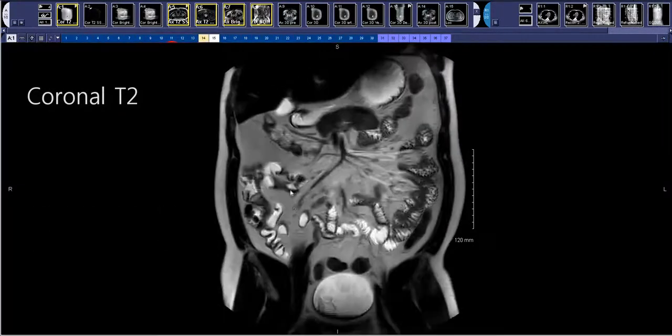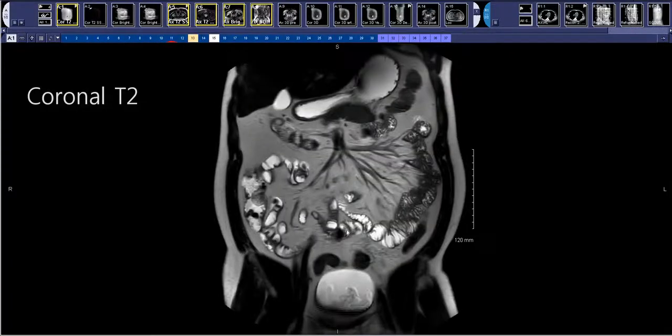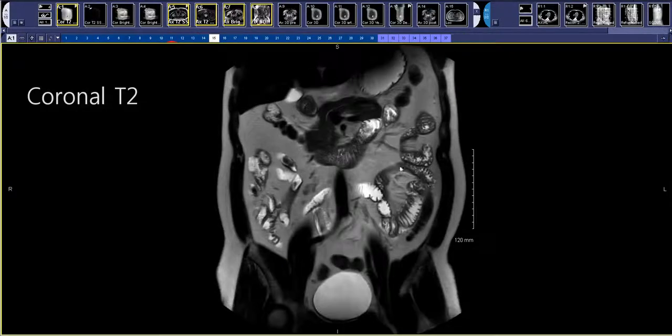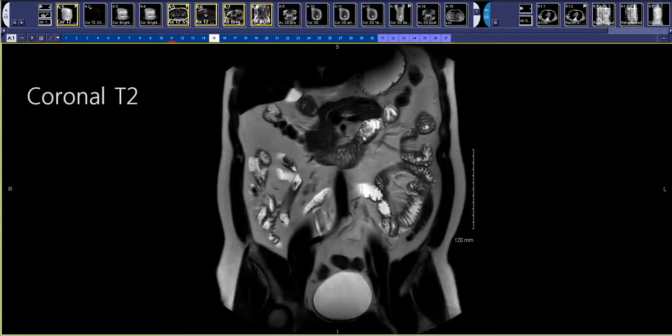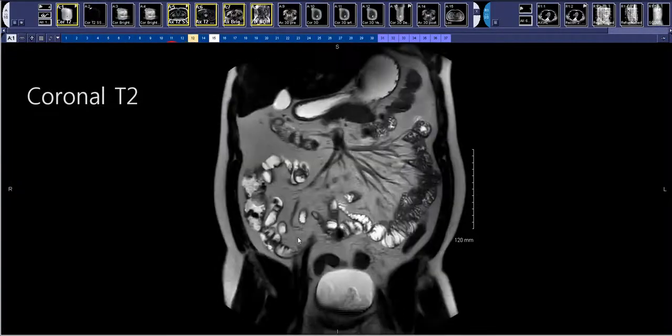And from there, I don't follow every small bowel loop discretely, but I like to take a quadrant approach, so I look at all the small bowel loops in the left lower quadrant, in the left upper quadrant. Here you should normally have feathery jejunum, which this patient has. These feathery bowel loops, right upper quadrant and right lower quadrant.